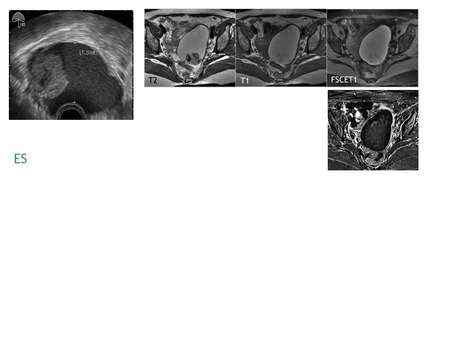Another important thing about endometrioma is that a malignant tumor can develop in the cyst wall. That is why we need to be careful if we see a mural nodule at ultrasound. Here is such a case of endometrioma, a large mural nodule at the cyst wall, but no enhancement of the lesion at contrast-enhanced subtraction image. So it is a case of large endometrioma with large blood clot.